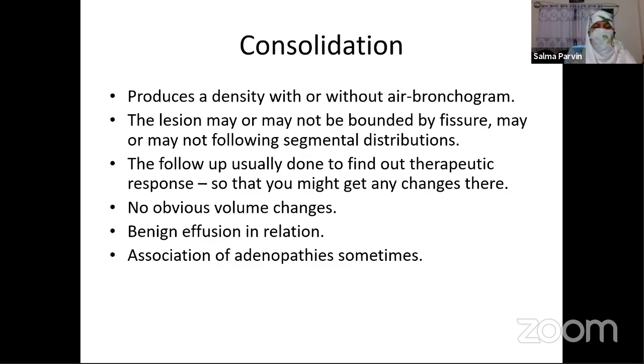And association of adenopathy sometimes, whenever there is consolidation due to inflammation. So the consolidation will have a diffuse distribution, will not produce any volumetric changes, will be associated with a benign effusion, and may be associated with adenopathies if there is an inflammatory association.